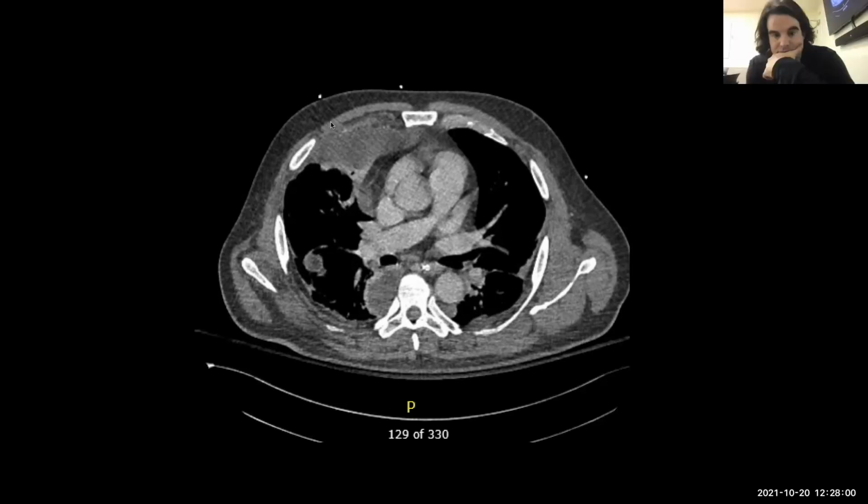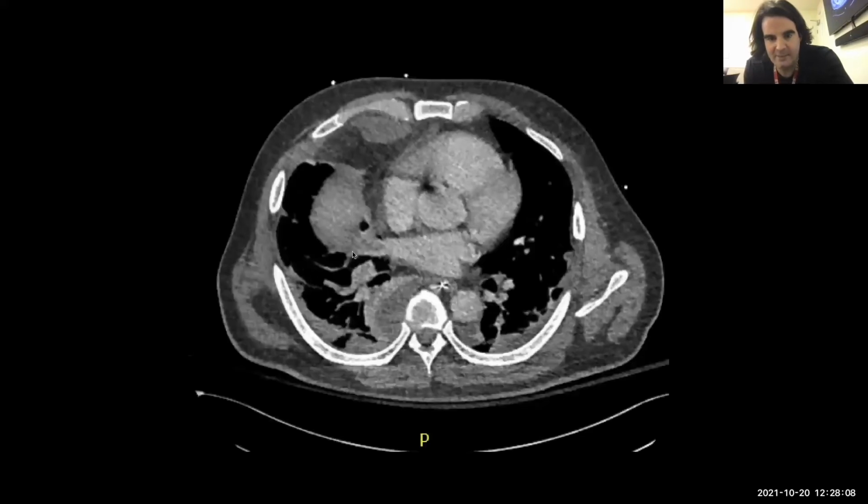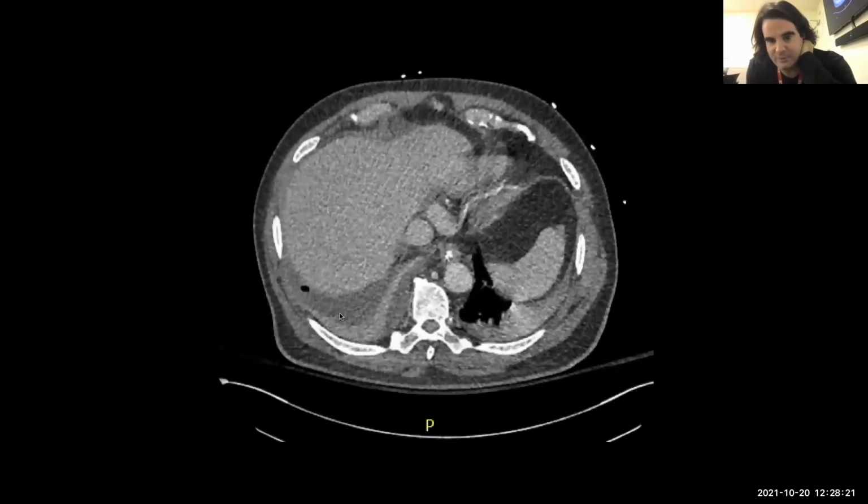Yeah, I agree. There are pockets of fluid here, and they seem to be a bit patchy throughout the thorax. In fact, you can see more as you go lower in the cut. They're more involved in the mediastinum and a little more paraspinal, as you pointed out, Charles. So this guy actually had quite a few pockets of fluid, including the posterior thorax.